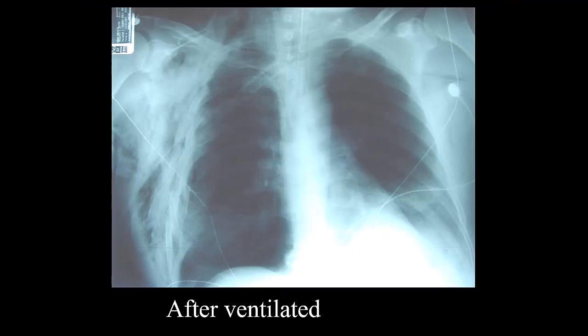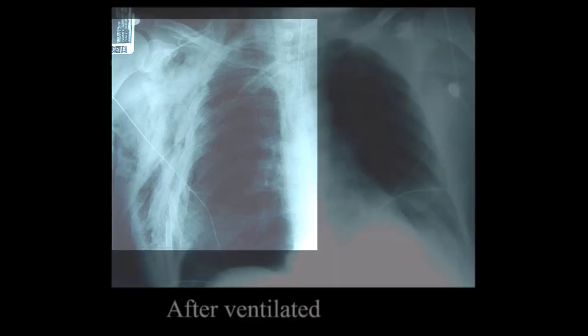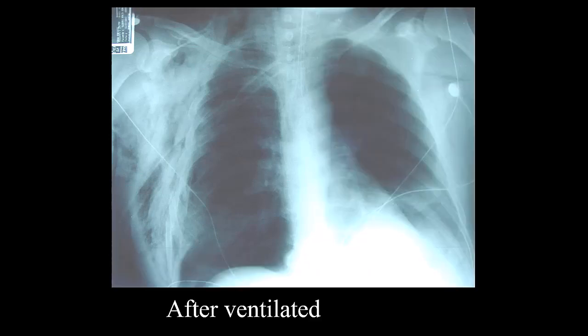This image shows a patient that had a hemopneumothorax had the fluids drained and their lungs ventilated, fully inflating the lung. Notice the chest tube that we have on the patient, the broken ribs, and the packing on the outside of the chest.